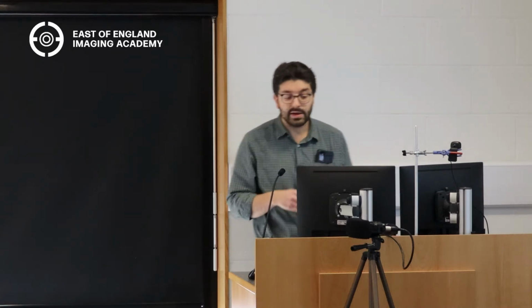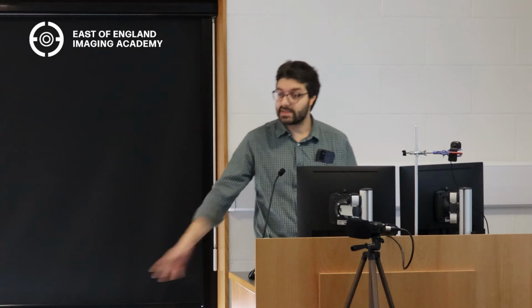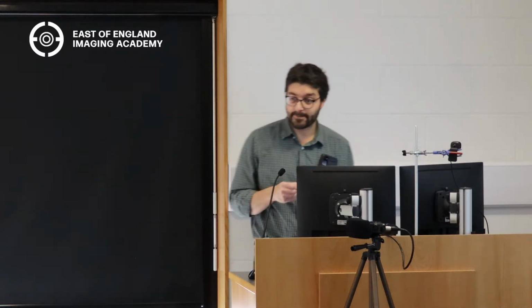Yeah. So it all depends on exactly where you want your contrast to be, and that will determine what phase you use. So if you're looking at the abdomen, what you usually want is a portal venous phase, which you may have heard the term before. What that means is you wait, the contrast goes out into the aorta, out into the SMA, feeds the bowel, comes back via the SMV into the portal vein, and then fills the liver. That's when you do your scan. It's about 60 to 70 seconds. That's when you do your abdominal scan. I'm a gastroradiologist, so it tends to be my sort of area of interest. Does that make sense? Yeah.